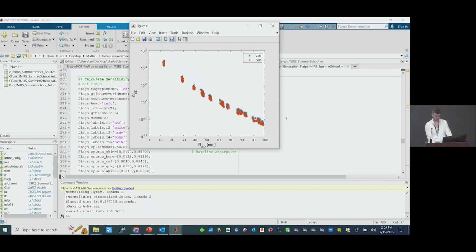I built this pipeline so that when you've finished generating the A matrix, this figure pops up, so you have another visual cue that, okay, I can move on to the next step in this pipeline. And remember what Adam was saying earlier, this simulated light fall off does not include any noise. So it is an idealized version that's not fully accurate to what you're seeing in your data.